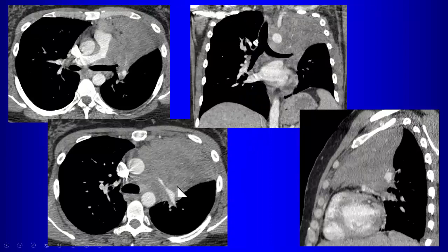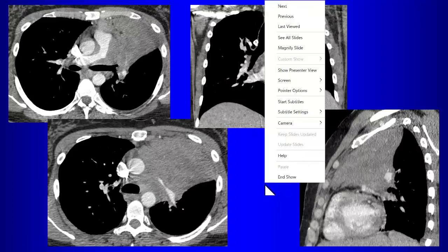And in this case, there's this large infiltrating tumor, see, encasing the pulmonary artery. So we're looking at collapsed left upper lobe, but because of this large mass causing the collapse of the left upper lobe. All right? So whenever you have atelectasis, look carefully at the fissures. If there's any bulging in the fissure, you have to be suspicious of an obstructive cause, mass causing the collapsed lung, and then we want to get a CT. Okay? All right, so we'll stop there.